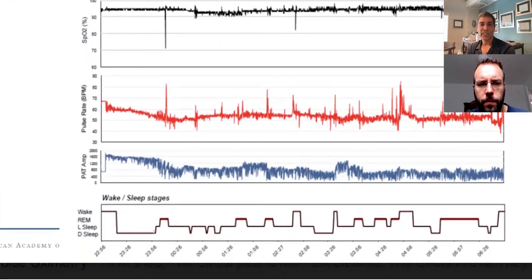And then this person, 1 cycle, 2 cycles. I'm never sure if this is all 1 cycle because the REM came pretty closely. So 1 cycle, 2 cycles, 3 cycles, this is all one, and 4 cycles, but not ideal. The REM cycles are broken. Does that make sense? In other words, within the cycle, the REM should be consolidated, and it's not, it looks like it's broken.